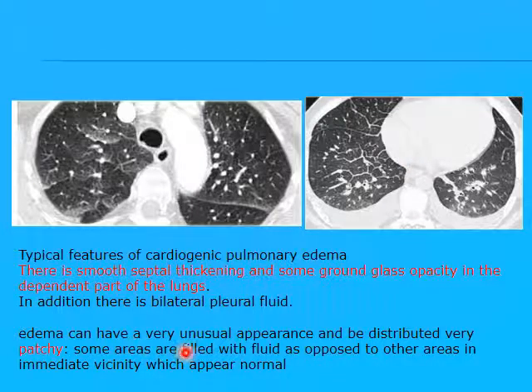Edema can have a very unusual appearance and be distributed very patchy. Some areas are filled with fluid as opposed to other areas in the immediate vicinity that may appear normal. Okay, patchy ground glass of gravitational distribution.